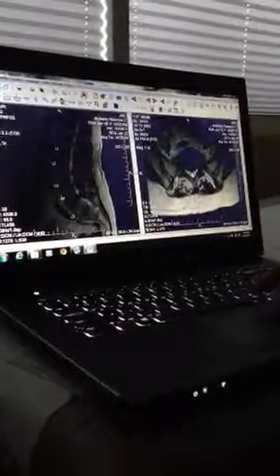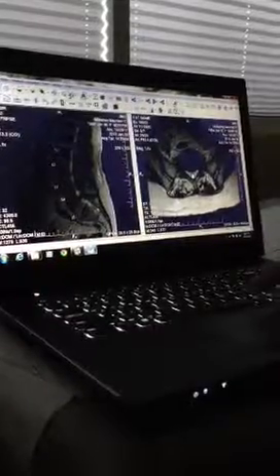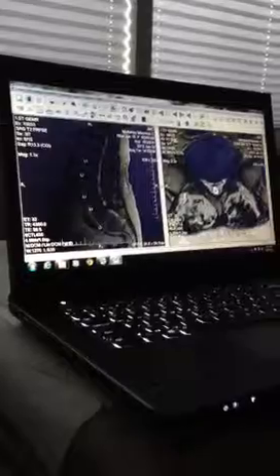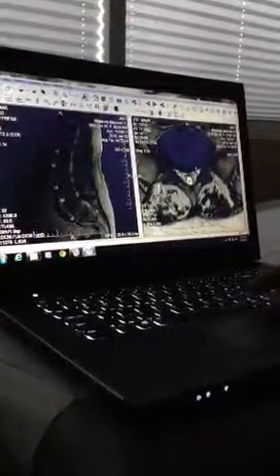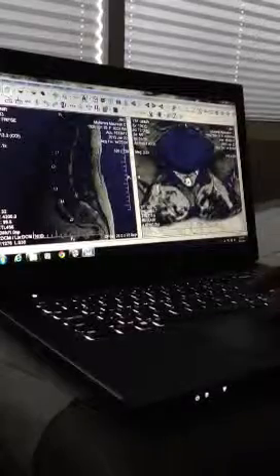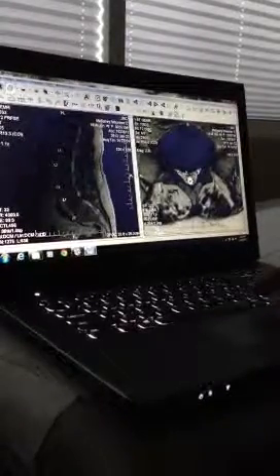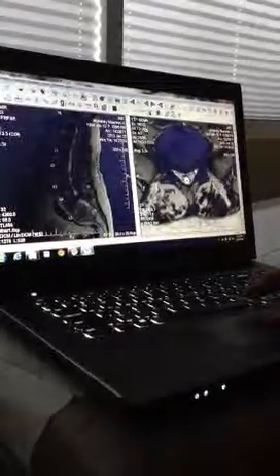They're difficult to see. We can try to magnify this at this level. Can you see them? I can see them. Mom can see them. Yeah, the little owl eyes. Yeah. Okay, and basically the disc herniation is kissing on both sides those nerves. Okay, the spinal canal actually is getting smaller down here.